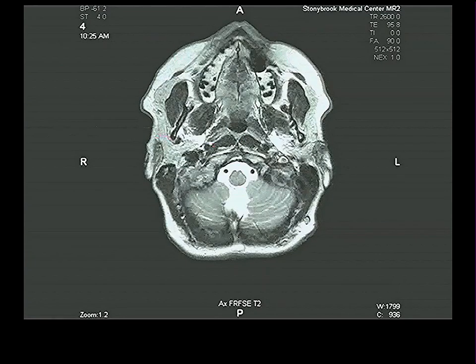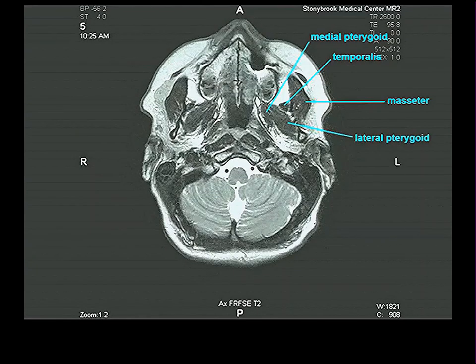Continuing up, yes, you can barely see here a little black stripe right there, which is the lateral pterygoid plate. Here is the remnant or the origin of the medial pterygoid muscle from the medial surface of the lateral pterygoid plate. Here's the lateral pterygoid arising from the lateral surface of the lateral pterygoid plate. And the lateral pterygoid is heading over towards the neck of the condyle of the mandible. Masseter and temporalis look like they did in CTs.